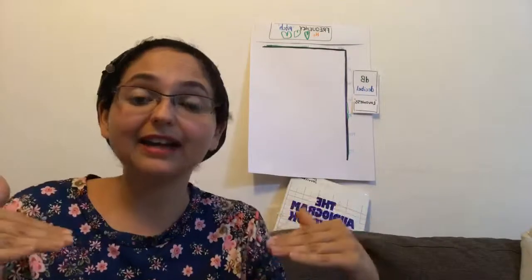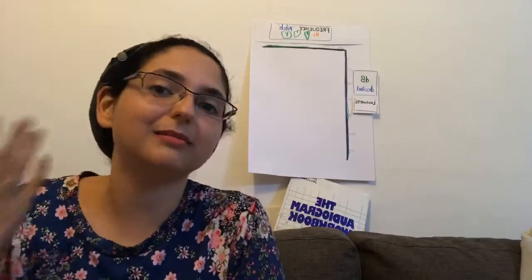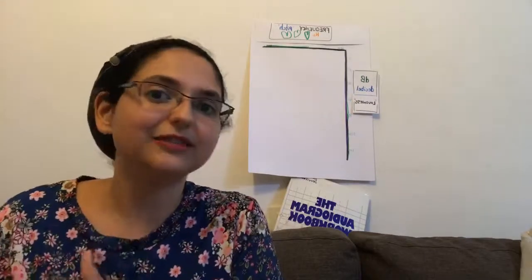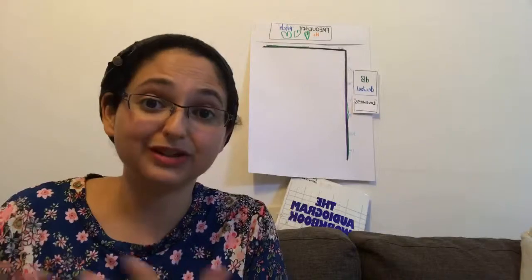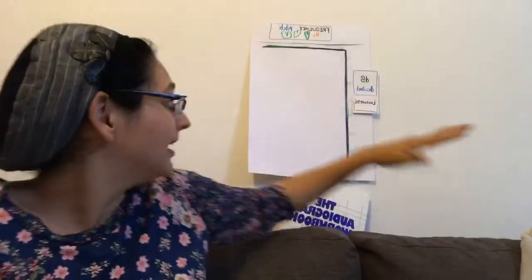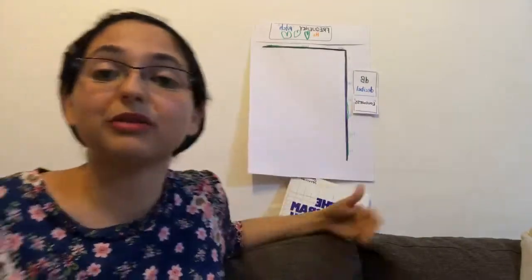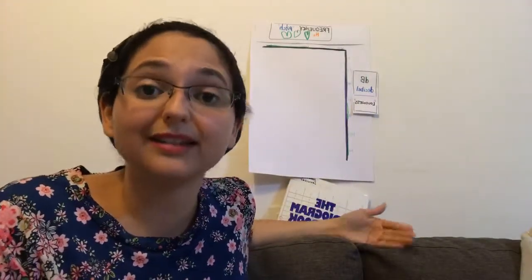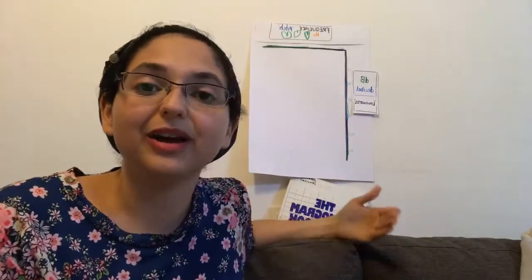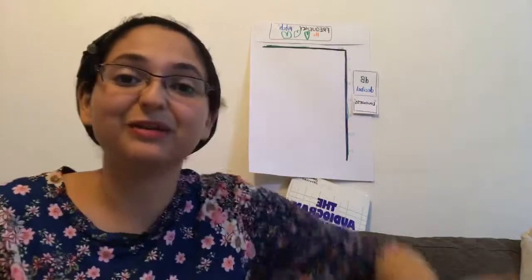If there's a flat kind of hearing loss and it's caused by something in the middle ear space, like fluid in the ears, then it's a different kind of treatment option when there's a different problem. And when the audiogram is all the way down here and there's a profound hearing loss, then we know that there are different options, like perhaps a cochlear implant, and knowing what the hearing loss is often will tell you what options you can then pursue.